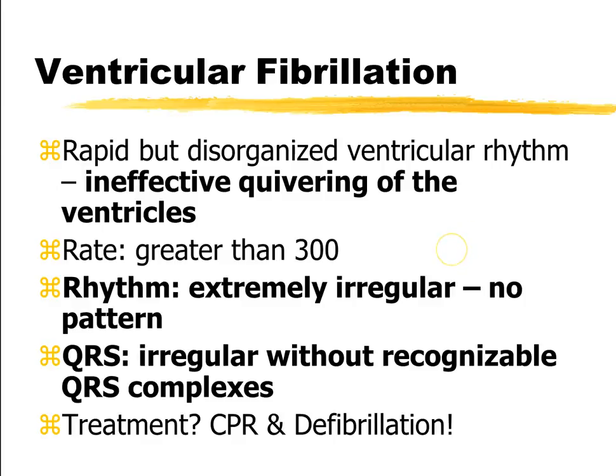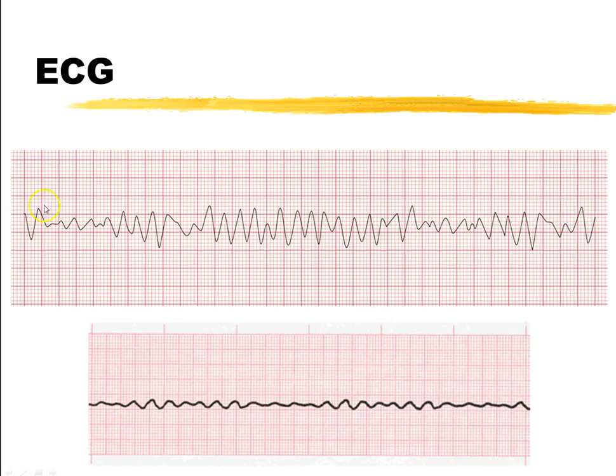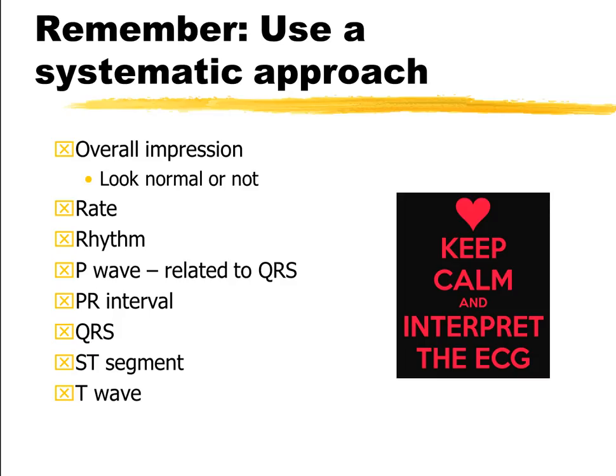And if that's the case, what's the treatment? They have no pulse? Yeah, you guessed it. If you're BLS aware, you're going to do CPR, right? And we're going to defib these people. So a couple different patterns here. This is called a coarse pattern, where it's really wavy. Again, we can't really tell. It looks sort of like VTAC in some places. And it could be a smaller waveform down here, a fine VFib. Again, no pulse. They're dead. We've got to do something, or they're going to stay that way.